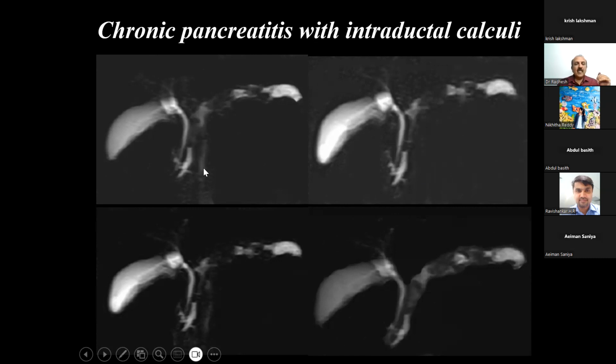And when we do cases of pancreatitis nowadays, we also do a CT and give HU values, the Hounsfield values like we give for the renal calculi. Because at least I've heard through my gastroenterology colleagues that they can also do a lithotripsy. Sir, is this followed, sir? Some people do lithotripsy. Very much so. It is.